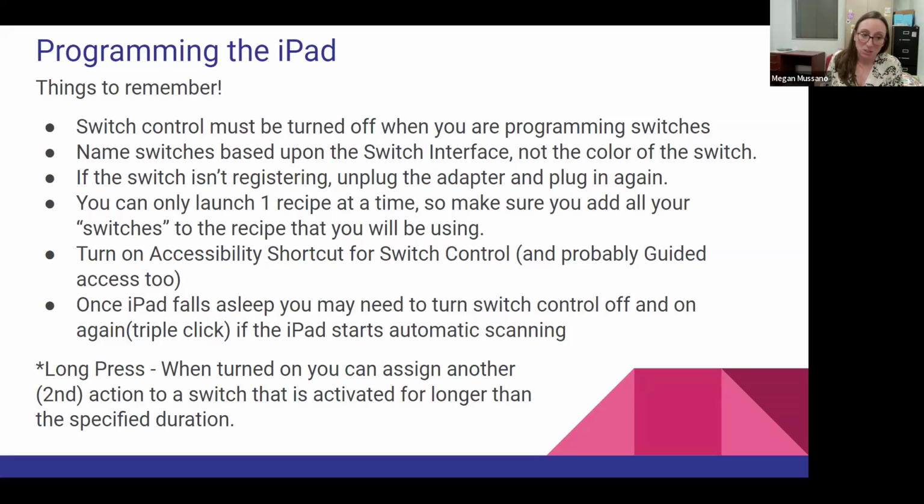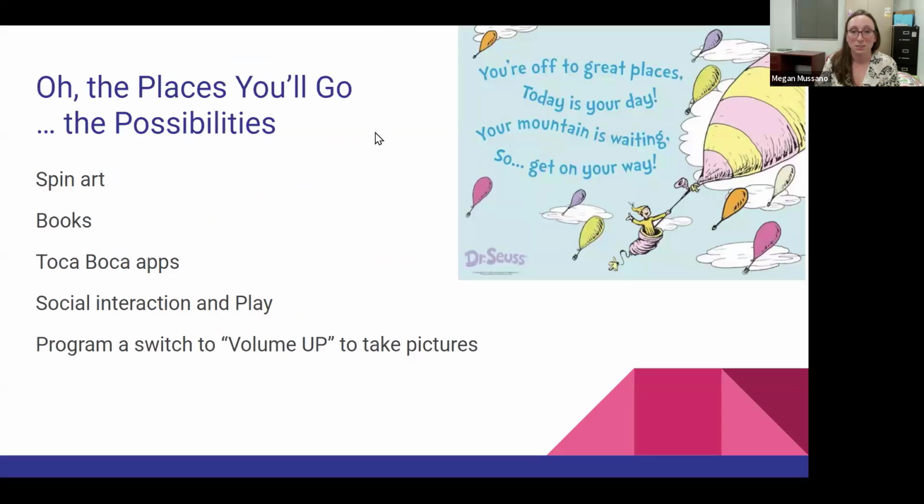Make sure you turn on the accessibility shortcut. Oh yeah, in the past, I haven't tried this lately with the new iOS, but if the iPad fell asleep, sometimes the switches act a little funky, so I just had to unplug it and plug it in again. So just teaching that little bit of troubleshooting is handy. And then remember, if you want to, you can assign a long press to each switch to do a whole other function. So that's just a list of fun stuff. And I like to say, oh, the places you'll go. There's just so many possibilities.